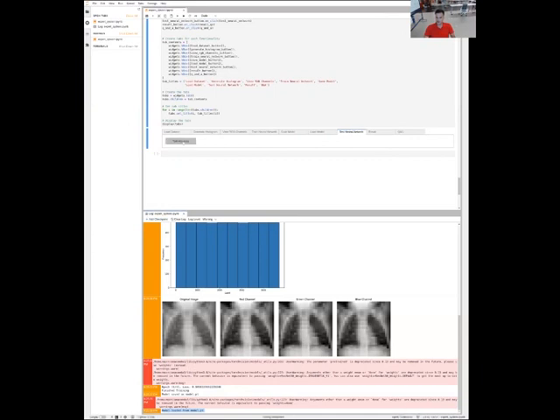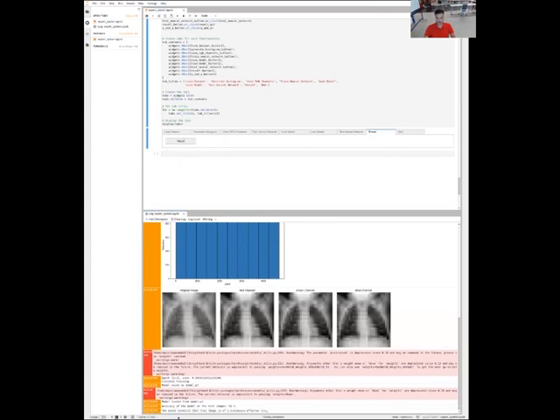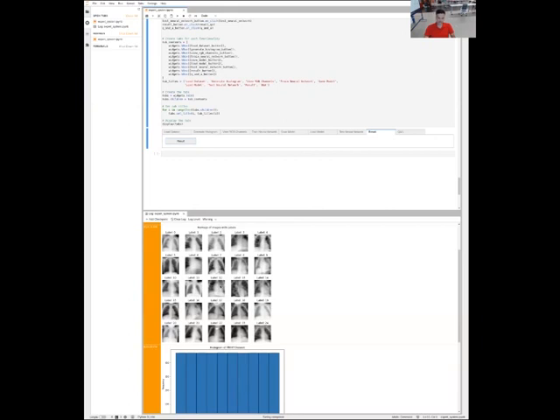So test neural network, let's see. Okay, so it has an accuracy of the model on the test images of 80%. And then the result, what is the result now? Finally, for the particular chest X-ray image, our model predicts that this image is of a pneumonia affected lung. So well, this is all about the pneumonia detection AI deep learning module, which helps us to detect whether the particular chest X-ray image has a lung pneumonia infection or not.